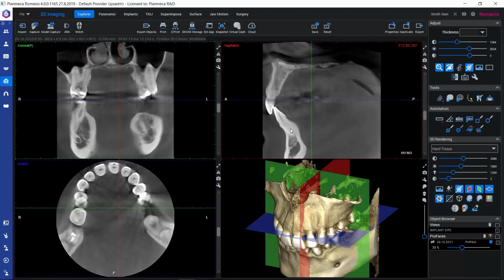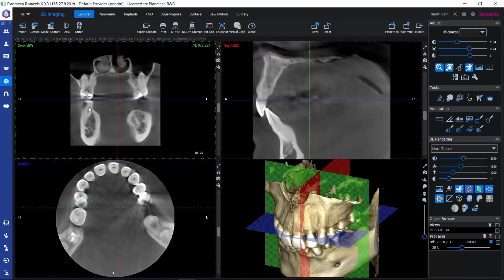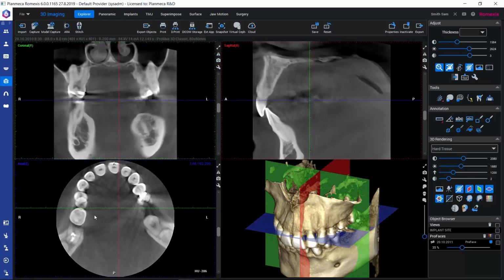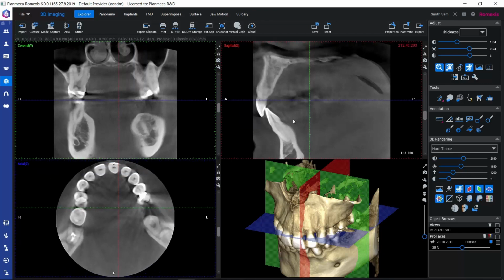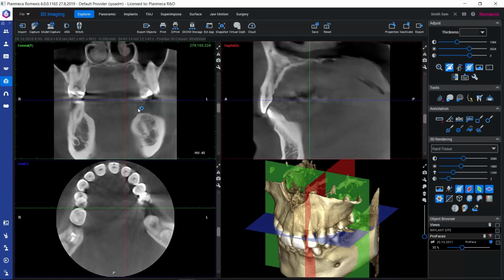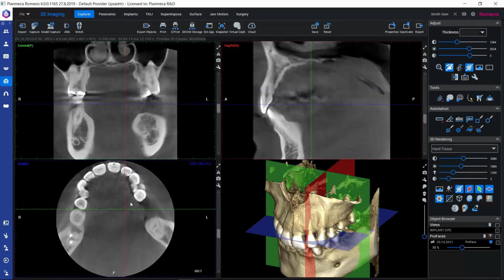so that's also possible. We have here this zooming tool, so when this is active, we can use our mouse wheel on top of any of these slice views in order to zoom in and out these images. But instead, if we deactivate the zooming tool here, we can use our mouse wheel on top of any of the slice views in order to browse through the data.